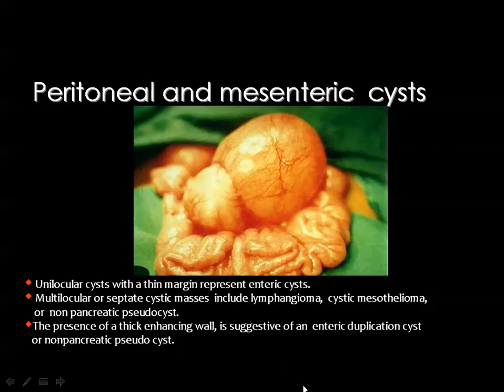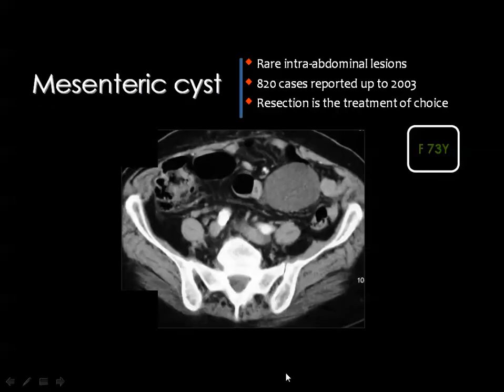Also, the presence of a thick enhancing wall is suggestive of an enteric duplication cyst.